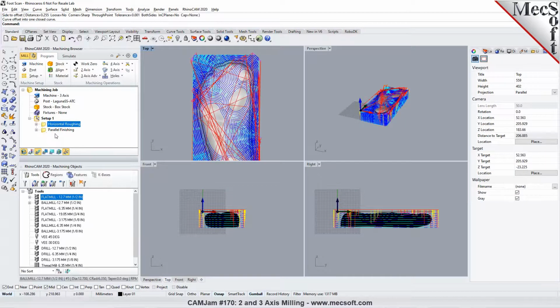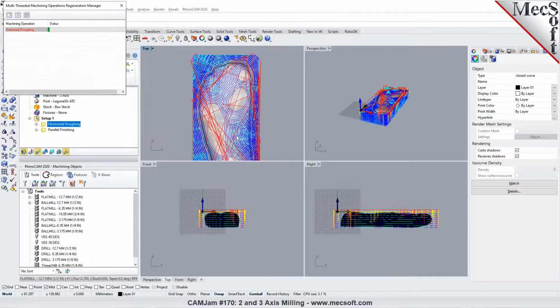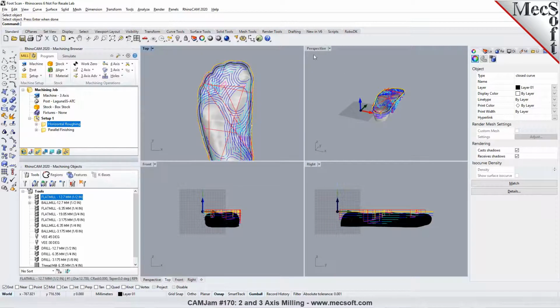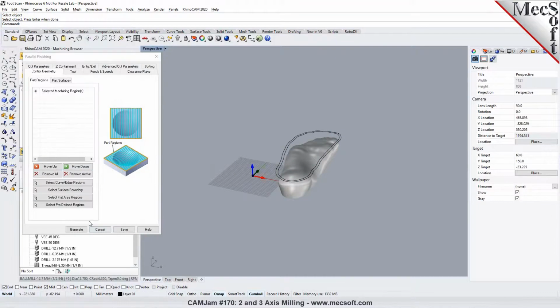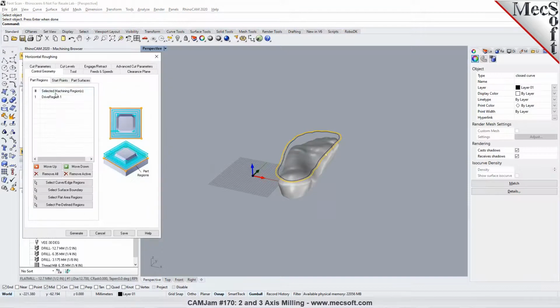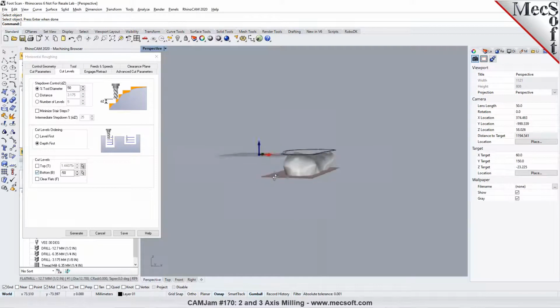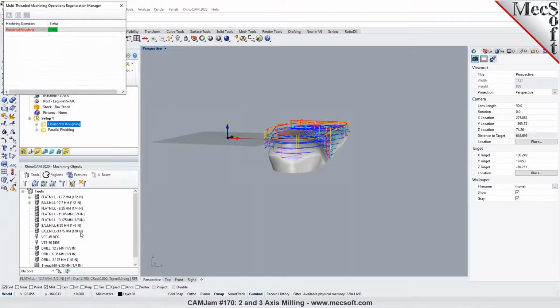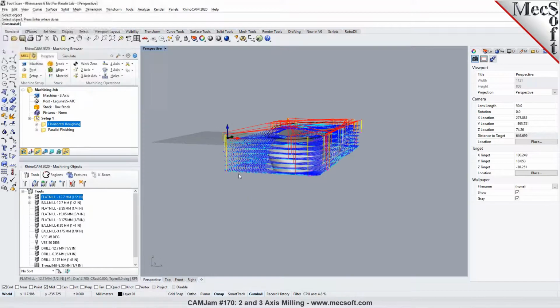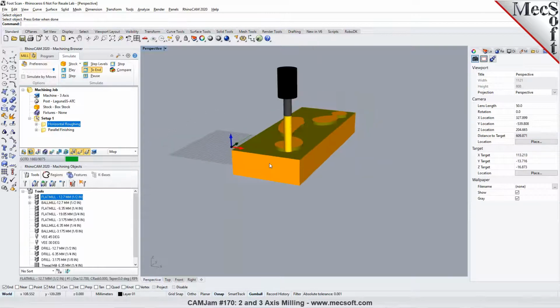And then for the toolpaths, I can go ahead and select that as my area to restrict or contain the toolpaths. Okay. So you're not turning everything around it into chips, right? So yeah. And then I can apply the same for the parallel finishing also. Now for the roughing, I could say, let's not pick any boundary here. And then let's put a cut level at the bottom. So instead of going all the way down to 50 millimeters, I can keep it 5 millimeters above right there. So you have something for it to, if you have a vacuum table, it'll be able to leave a little floor on the bottom of the part.